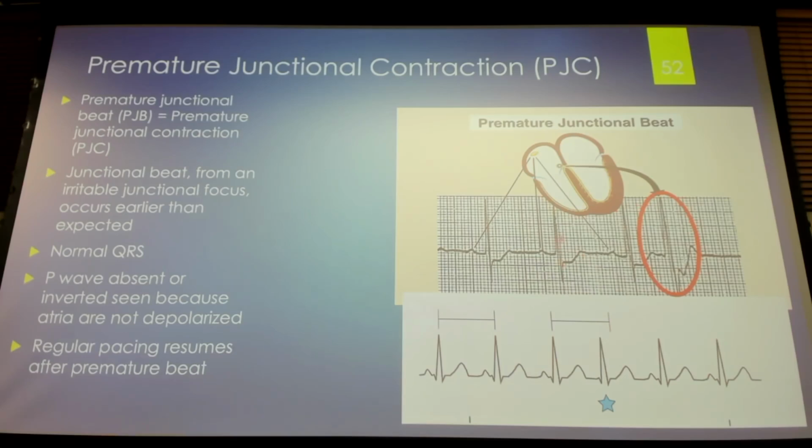And if you look at these other ones, you can see your T kind of comes up here like this. So your T is coming up. I know that that looks like a P, but it looks exactly like this T wave. So really you have a little bit of an inverted P right here with a narrow complex QRS, and then we go back to our baseline. Okay, we also have another premature beat here, and you can see this one does not have a P wave associated, not even inverted, and this is a premature junctional contraction.